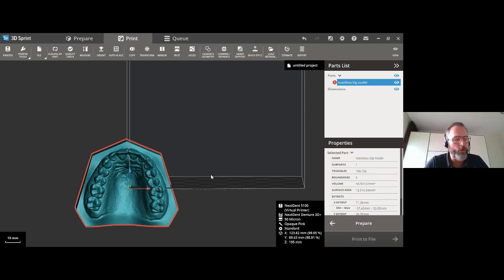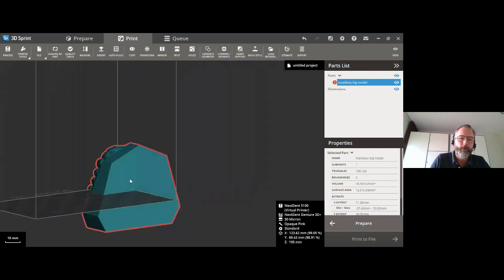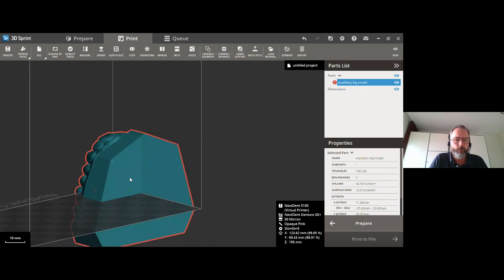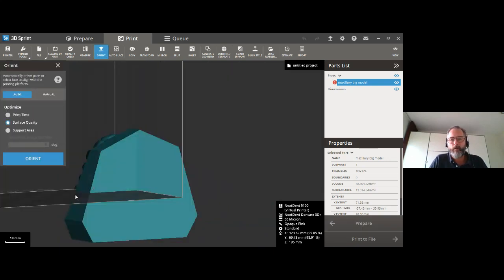This is why we work with the CAD software companies, the dental design companies, because then they can say to us, or we should say to them, that this is the orientation that we want. So if you can give this information to your STL file so that this is the bottom of the part, then at least the part will always come in like so.